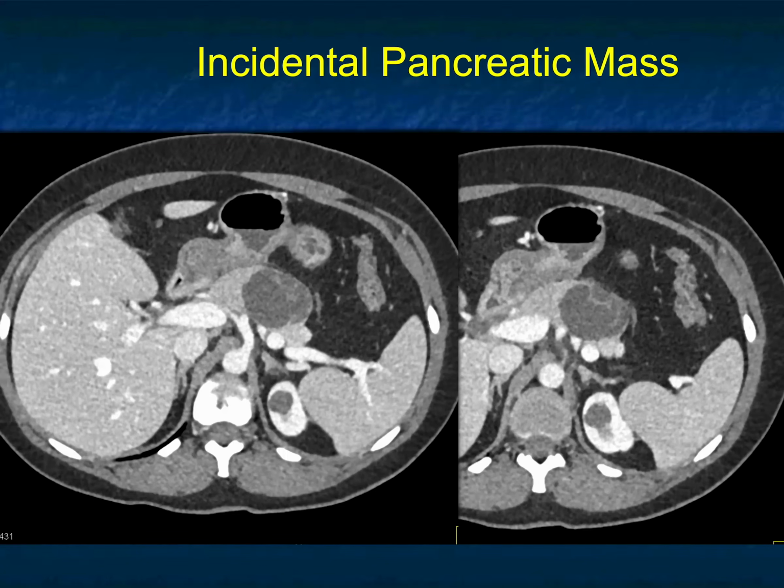What about this case? Incidental pancreatic mass. Mass in body of pancreas that's cystic with septations. Yes, you can consider serous cystadenoma, possibly. It's not an IPMN with that septation, but hopefully you would know this patient was a 45-year-old female. That's the age range, and that's the location you typically see a mucinous cystic neoplasm, MCN, of the pancreas.